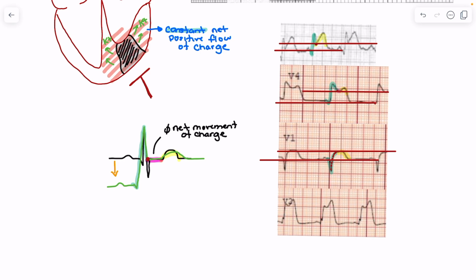On this final one, again, we're looking at a QRS complex that has a few deflections from baseline prior to entering the T wave. We can see a more defined segment of rest here before we enter our T wave, and that is again going to be where we have our J point. So the point in between the changes in deflection for the QRS and that rest period is our J point. So we can draw our line through that J point, and then we're going to look at the PR interval. In here, we can draw our line from that preceding PR interval, and that's how we're going to determine our ST elevation from baseline for these patients.